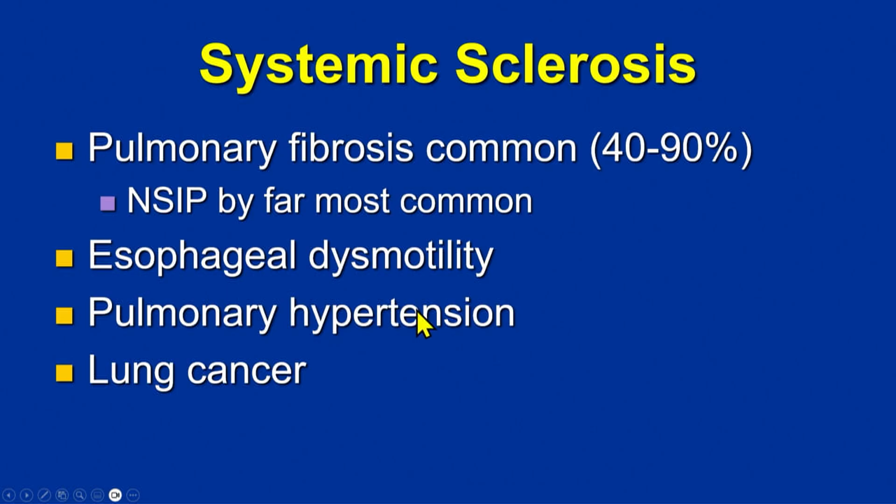And so we've noticed, at least anecdotally, and I think the literature does support this, that patients with systemic sclerosis ILD are more susceptible to developing these small adenocarcinomas than perhaps other types of CTD ILD. And because systemic sclerosis has an NSIP pattern, which looks like ground glass opacity mostly, finding these small ground glass nodules growing within those areas of NSIP can be quite challenging. So I just want to show you a couple of examples so that it's in your working memory.